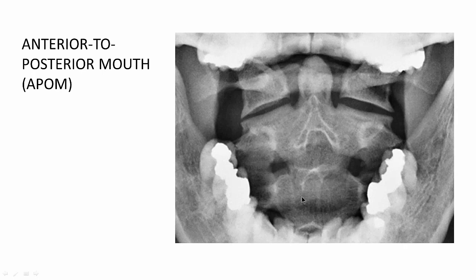So what's this right here if I put a tag on this thing? Well, it's an increased density of bone. So it's got to be something sticking out that's been squished flat by the steamroller. It's got to be the spinous process of, can't be 2, there's 2 right there, that upside down wishbone. That's C3.